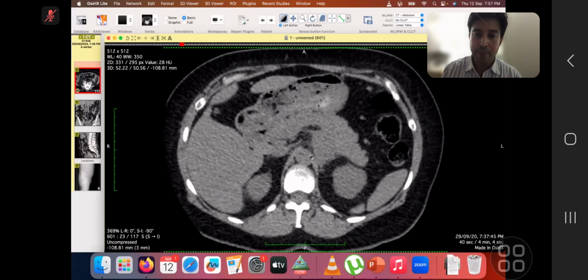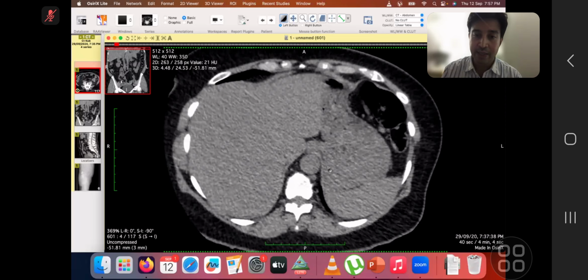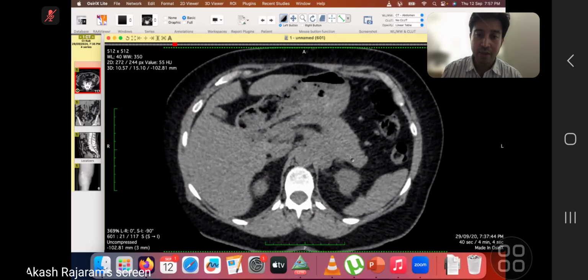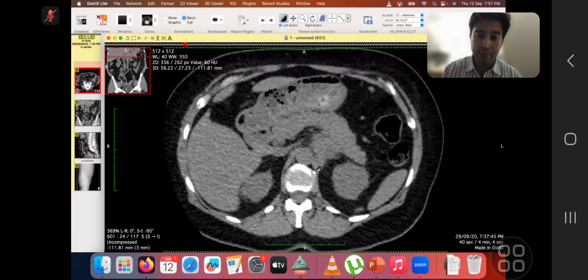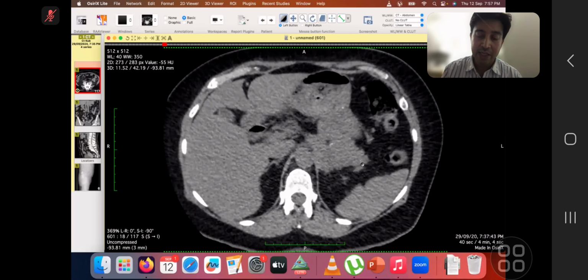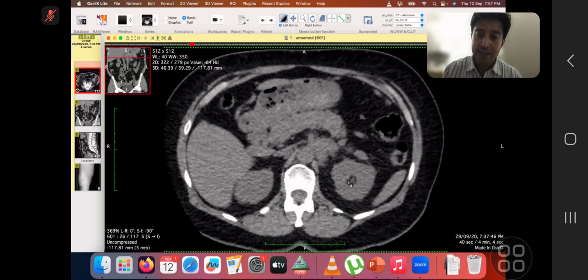You picked it up. You mentioned initially, I mean, after this, on the second look, you picked up there is a lesion centered in the adrenal region. The lesion is abutting the left crus of the diaphragm. Also, you can see that the fat planes with the pancreas are not well made out. The adrenal gland is not separately seen.